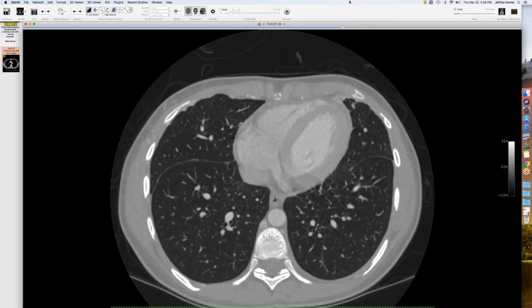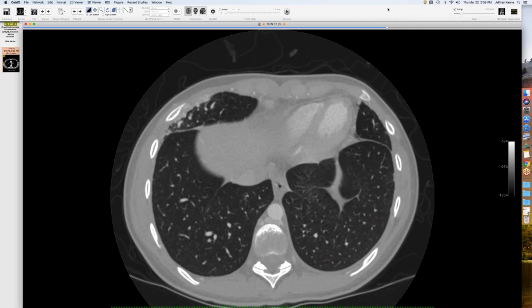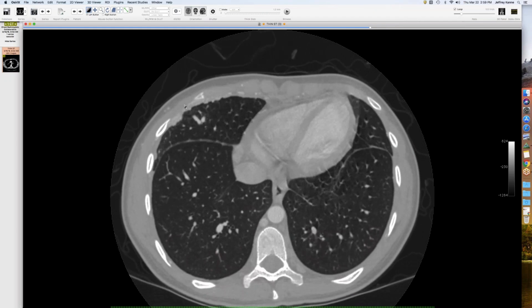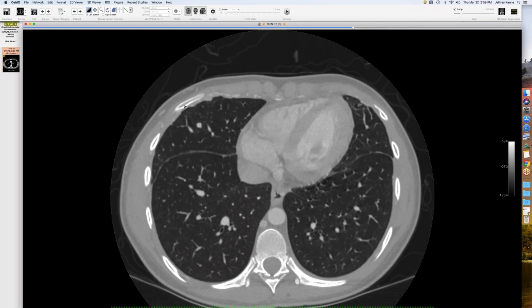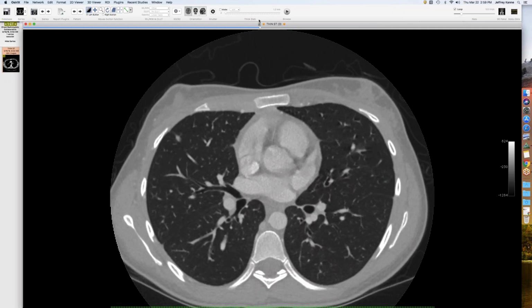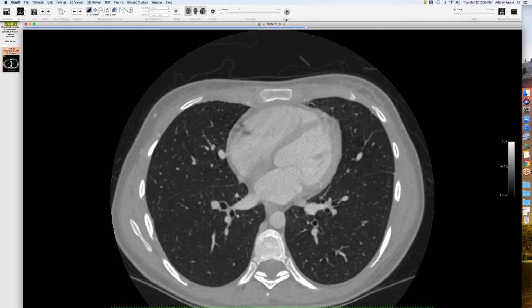Yeah, something. No thickening. There's no findings of trauma. I mean, I guess it's possible. That would be a good explanation. And the fact that it's isolated to one lobe, it just doesn't look like your typical anomalous vessel. I mean, it looks like multiple different vessels. So that neovascularity that we associate with a pseudo sequestration. And no rib fractures on that side. Yeah, we looked for all trauma.